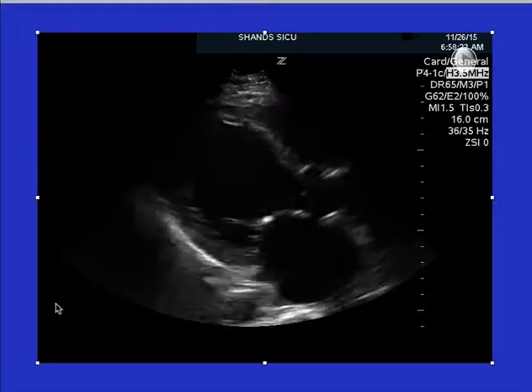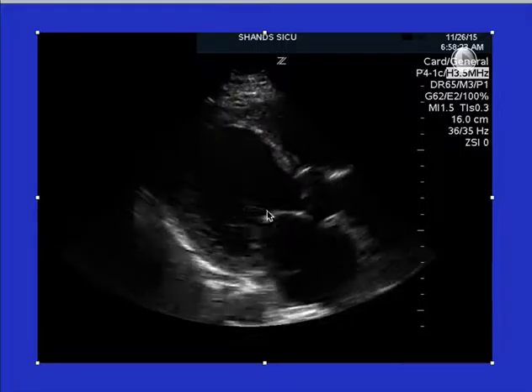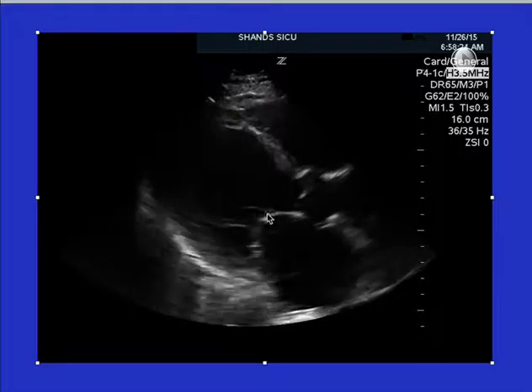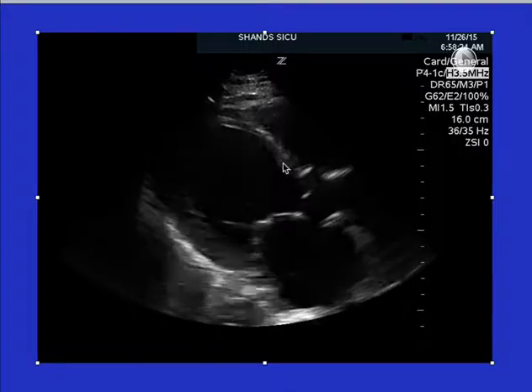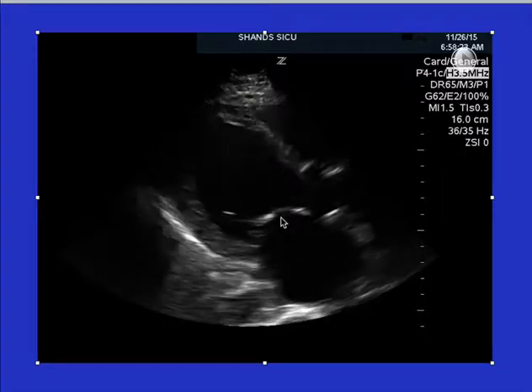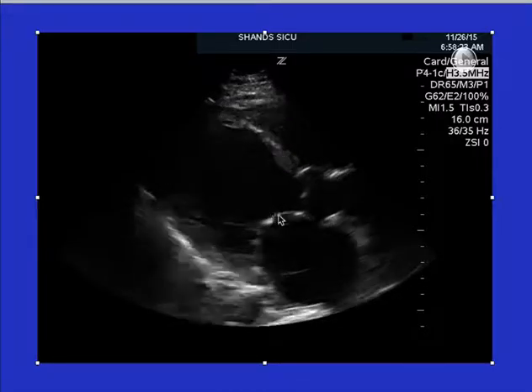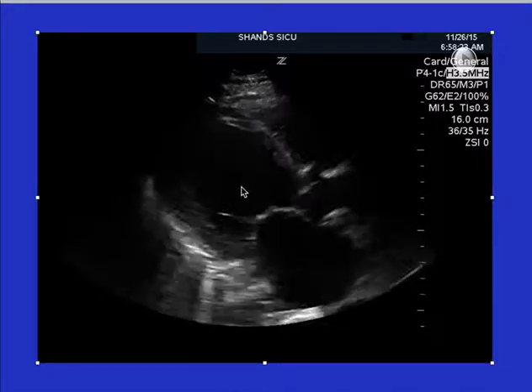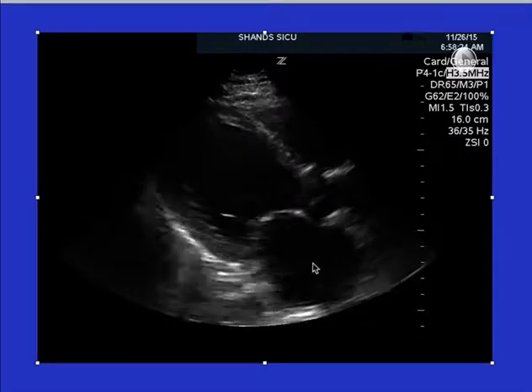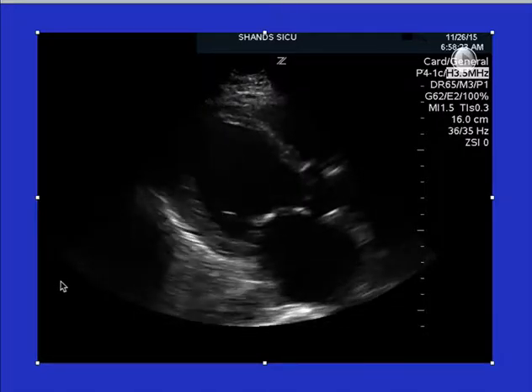Here you see the opposite. This is a dilated left ventricle. This is the mitral valve, and you can see it's not even coming close to the LV wall. And remember, it has nothing to do with the mitral valve. It has to do with the left ventricular function. Now, you can have some mitral valve stenosis or mitral valve calcifications that may affect this, but what you're also looking at is the function, the volume in the LV. You can see that the left atrium is a lot larger than normal, as well as the left ventricle. And you can look at this in multiple different views.